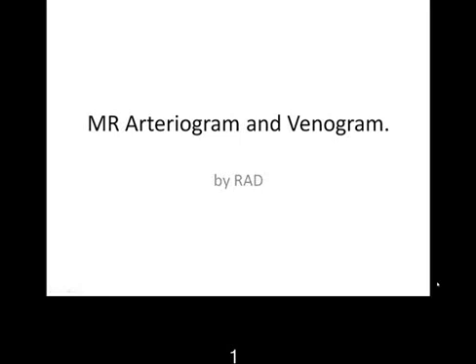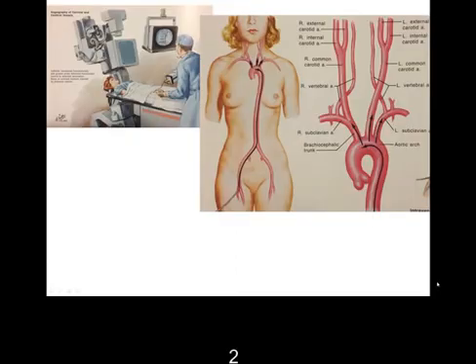Everybody, I'm going to talk about MR arteriogram and venogram. First of all, I have to show you what a traditional arteriogram and venogram are without MRI. Then I can show you what the MR arteriogram and venogram look like.